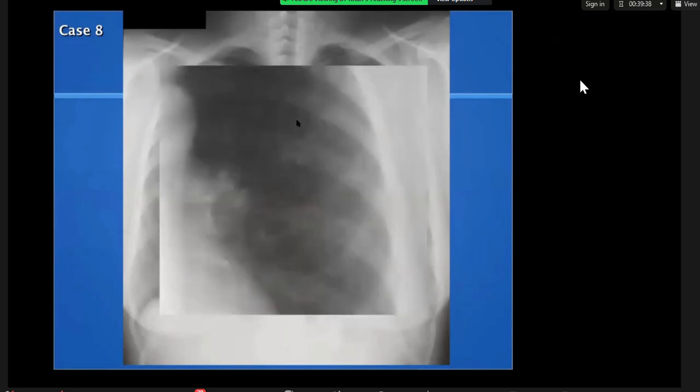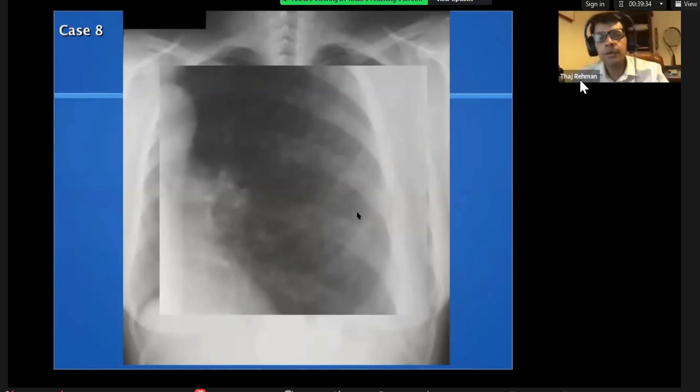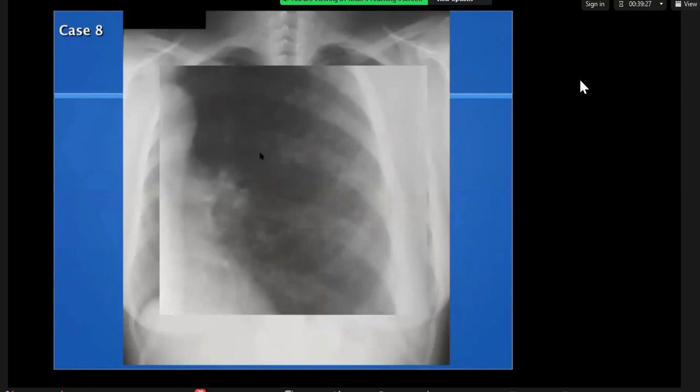Yeah, I can appreciate it better now, actually. Nodules now? Yeah, in the bigger picture. So, do you want to give differentials for this? There's multifocal nodules with no significant predisposition. So I would be thinking of random nodules, metastases, sarcoid.